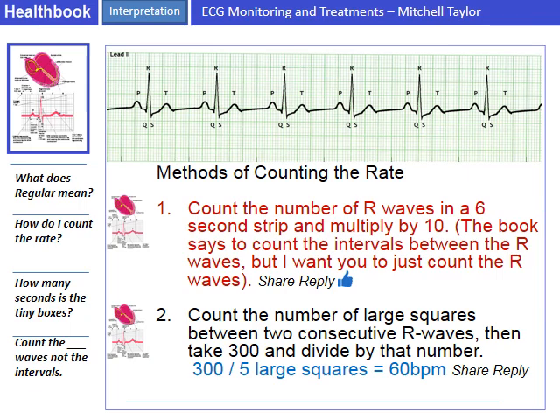You can see down at the bottom of the strip a little mark marking 1 second. You go to the second mark, that's 1 second. The third mark, that's 2 seconds. Fourth mark, 3 seconds, 4 seconds, 5 seconds, 6 seconds.